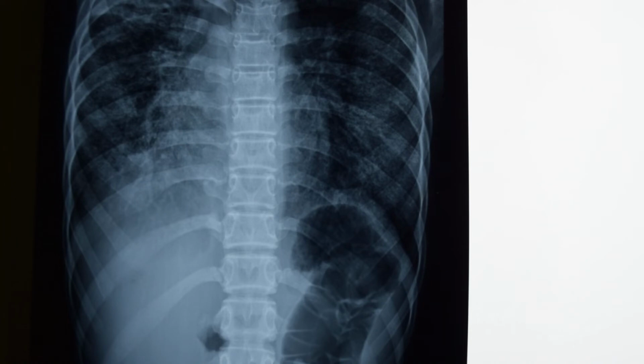The differential diagnosis on this X-ray comes first of all the miliary tuberculosis. Miliary tuberculosis has the similar X-ray with small nodules of 2 to 4 millimeter in diameter size, uniformly arranged in both lung fields, and patient's history is also very important.